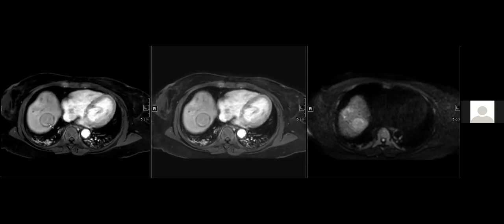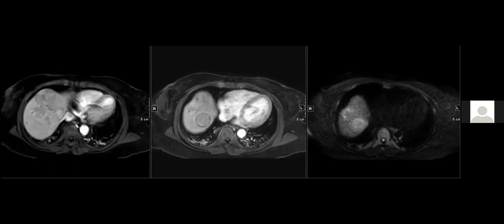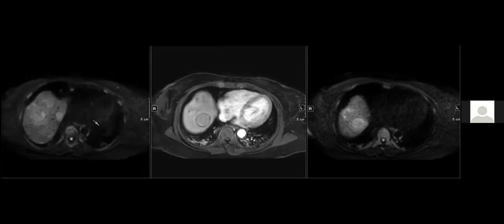Usually you see a bigger nodule, and the internal nodule is much smaller. But in this case, we just caught it at the time where the internal HCC almost completely replaced the underlying dysplastic nodule. So this is another teaching point to complement the other case.